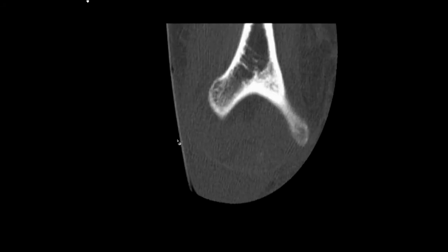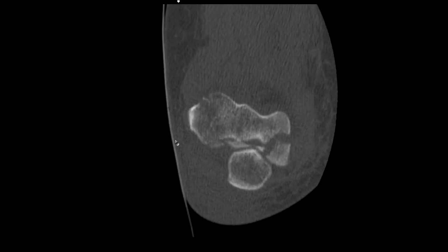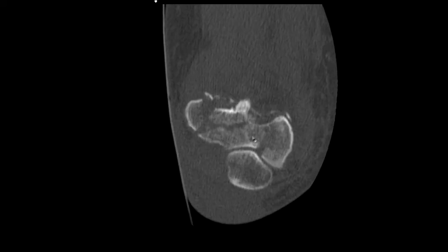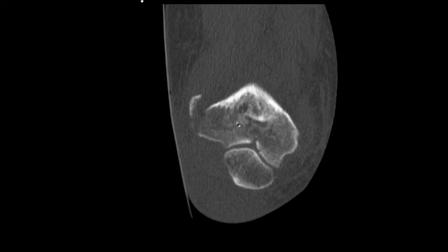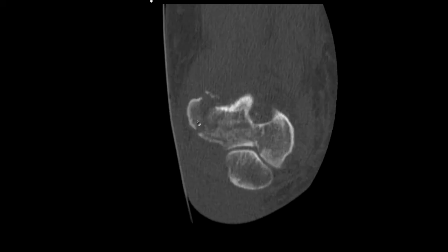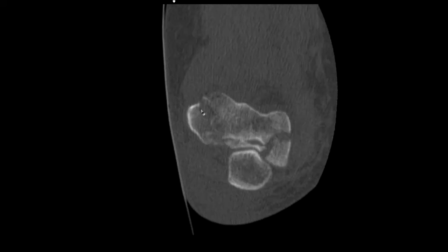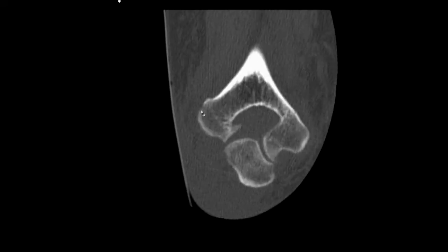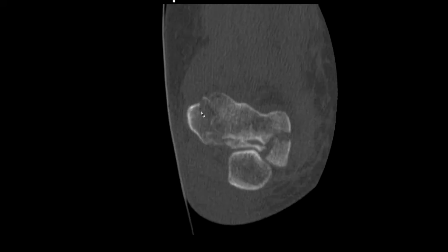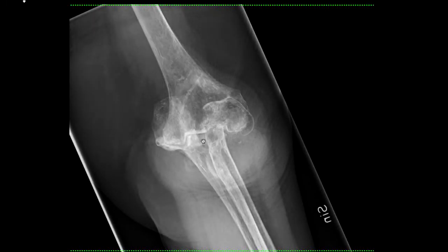So this is the same patient, and on the CT scan you can see that it's actually much more stuff than we found. Fracture there like we saw in the picture. There are many more pieces here, and it's basically much uglier. But in conclusion, what we didn't see on the last image is that the fracture is completely across the whole humerus. And that is really important for the orthopedics because they want to know what material they want to use for the surgery later on. Anyways, that's it.